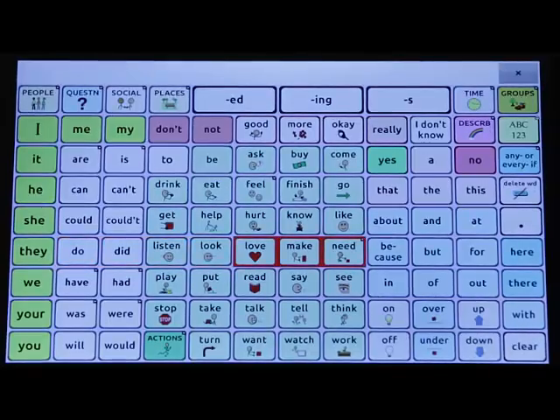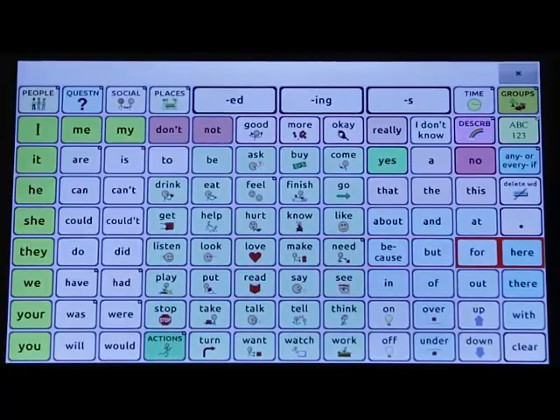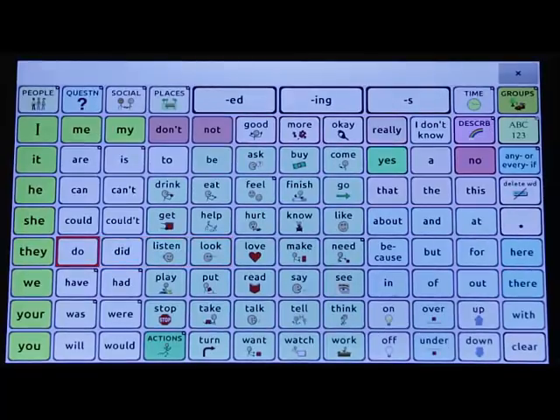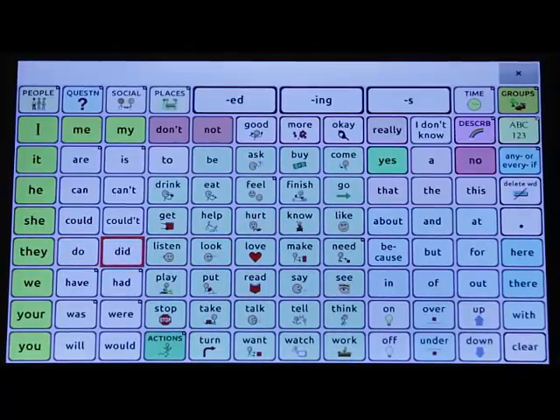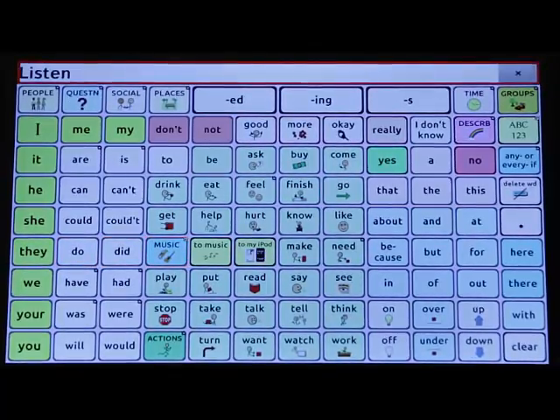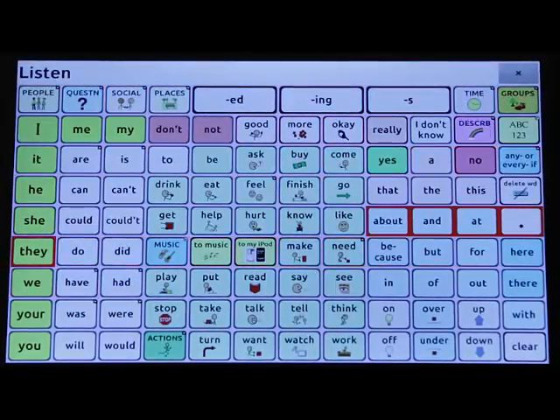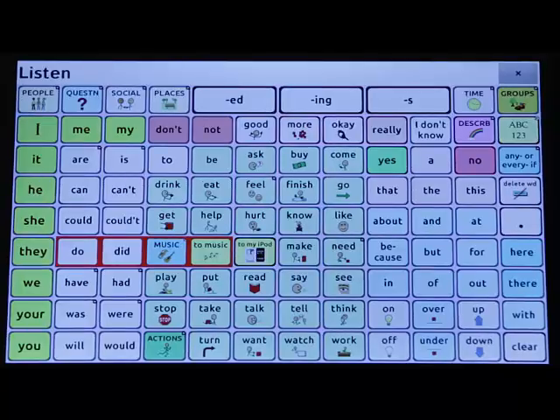Flow. This is a method recently developed by Saltillo. Mathematically, it gives you all the buttons on the page at the same rate, that is, switch hits plus time taken into consideration. It does not have consistency. This might be a benefit to clients that watch their target and can activate the switch when the target within the group is highlighted.